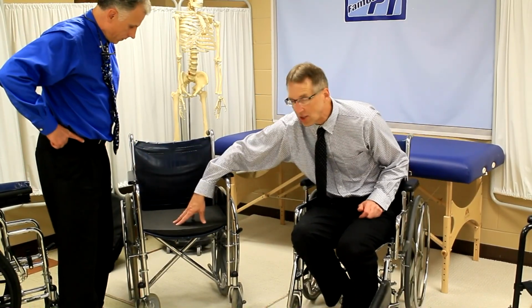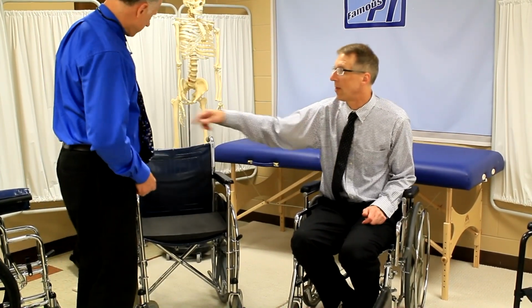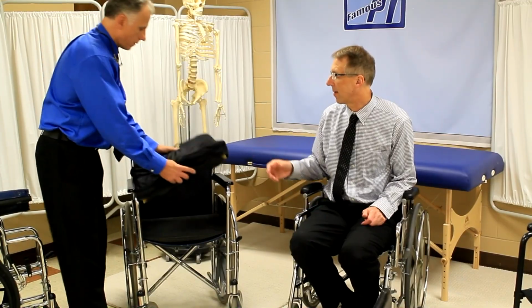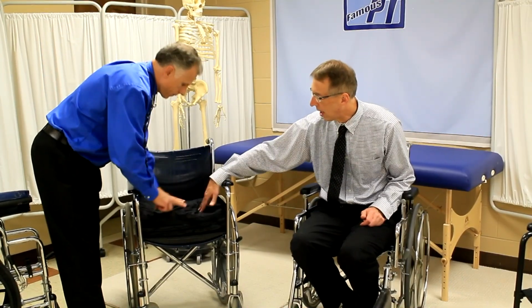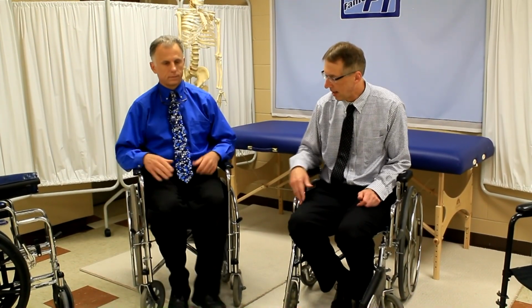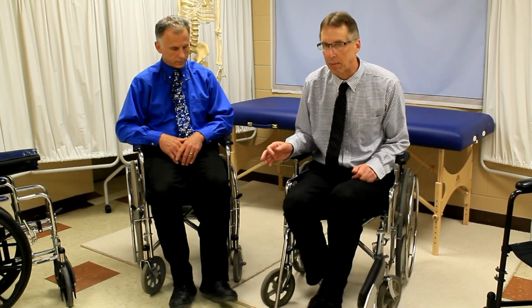So in addition to that, because you're sitting all day, a lot of people are going to need some type of cushion. So Brad, you want to throw the cushion on there? Now this is a nice cushion here. Now that you've added all that, go ahead and sit down once, Brad. Now look, his feet don't touch the ground anymore. And for a lot of people, you're going to want to be able to touch the ground. Some people use it to propel their chair. Just for getting out of the chair, it's easier.